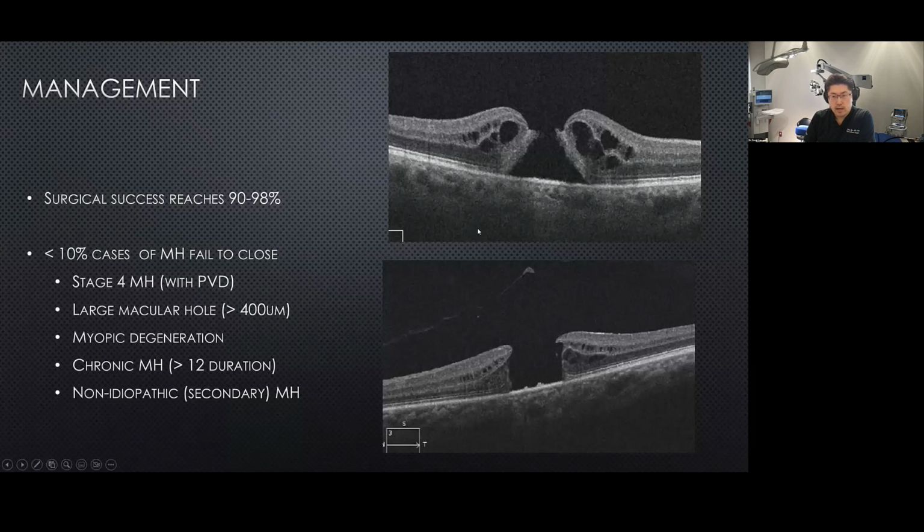For example, keeping this very simple, the edge of the macular hole appears like a drawbridge. If you imagine, this looks like a smaller macular hole that looked relatively fresh. And if you can imagine this drawbridge coming down, you can achieve pretty good hole closure. Now, if you look at the picture below, this is a larger macular hole with what we call an open, flat formation.